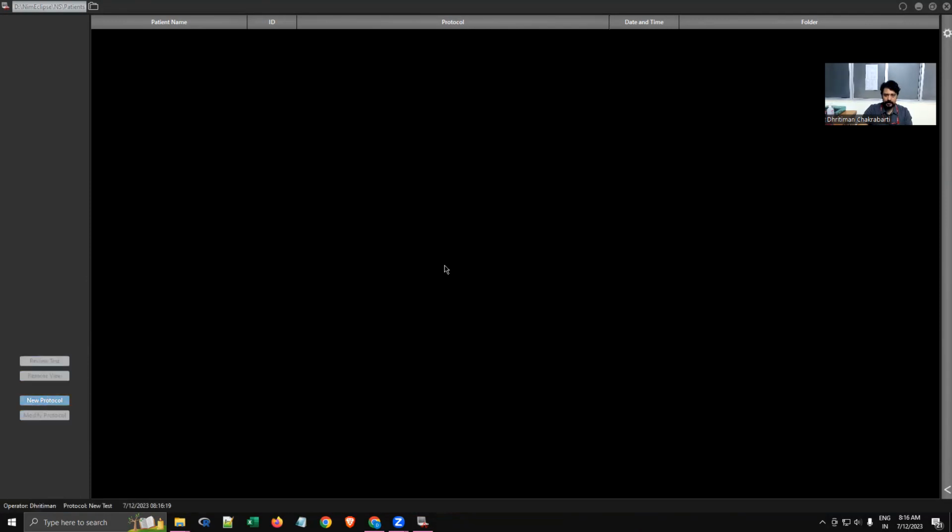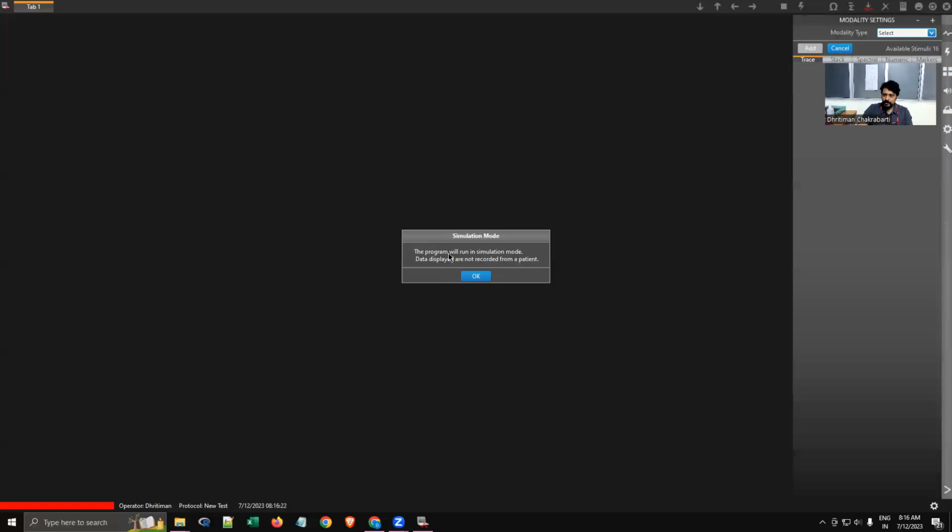Okay. So when you switch it on, this message will come. This basically means that the program is running, but it is not going to do any sort of stimulation or recording. So you just press OK and continue. At the bottom, this type of message will keep coming throughout the time. Okay. So now coming to the parts of this software, let's start with making the protocol. And while we are making the protocol, I'll be discussing all the parts of this software.